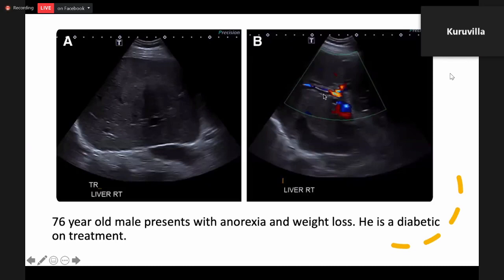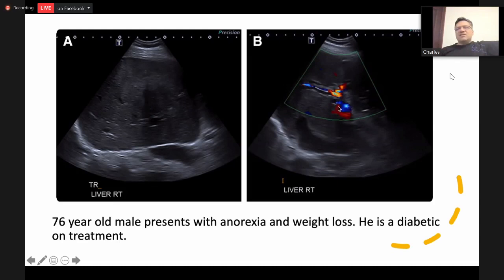Sir, the vascularity, one is CBD, sir. No, okay. It's the bile ducts. Bile ducts, not bile duct. Contrast inside. So you have a lesion with distal IHBRD. You're seeing a heteroechoic lesion with distal IHBRD in the ultrasound.